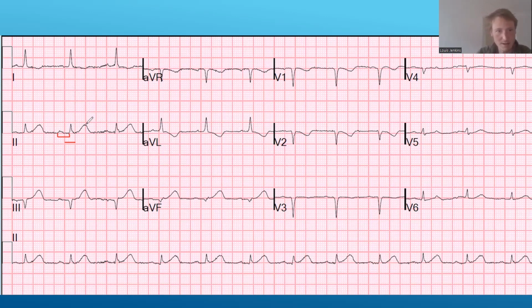But then I look at this T wave. This T wave has me a little stumped because it's the same height as the QRS complex. That's a little weird. That's not normal. So then I look at lead 3 over here, and I look at the amplitude of the T wave, and it's probably about the same as the amplitude of the preceding QRS complex. That has me a little stumped. That's not normal. And then I look at AVF and I see this tiny little QRS complex, and I see this proportionately massive T wave. Now I'm concerned. And when I couple that with this inverted T wave in AVL, now I'm really concerned.